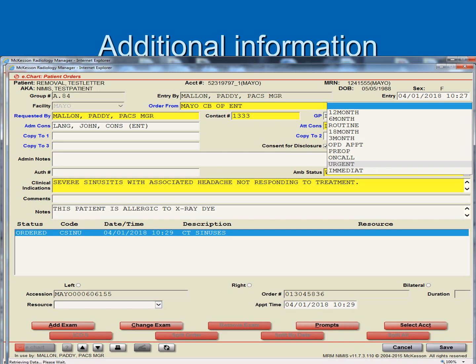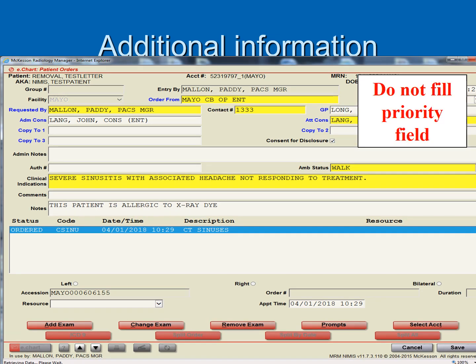This is never used in Mayo University Hospital. This section is used in some facilities to arrange urgent examinations and prioritise the reporting of the same. In Mayo, for urgent examinations, you need to contact the modality team or the radiologist to discuss prioritising your examination. Out of hours, you may need to contact the on-call staff to arrange your exam. Never assume that changing the priority to urgent means that we know you have an urgent request in place. This may in fact delay your exam because we do not have any staff who are monitoring priority studies.